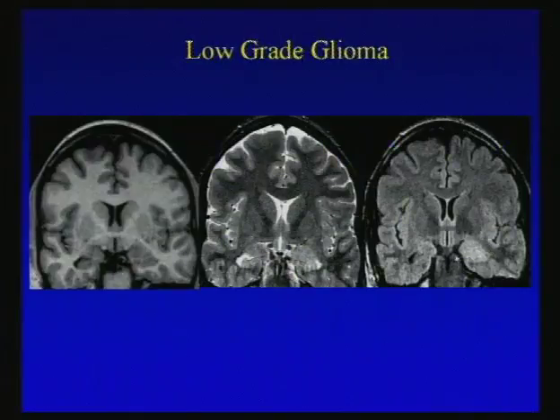So certainly, in this situation, this would not be a case of mesial temporal sclerosis because there's abnormal enlargement. So our first thought is to exclude something like an encephalitis. Clinically, the patient has no symptoms of herpes type encephalitis, so we can start to think of other things such as a low-grade glioma. On contrast imaging, I'm not showing you that slice, but there was no contrast enhancement.